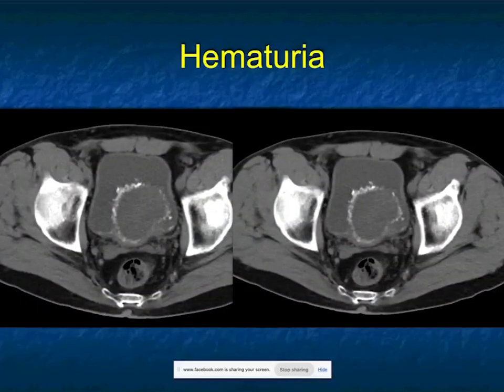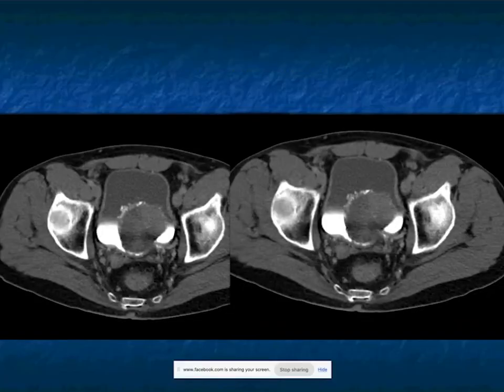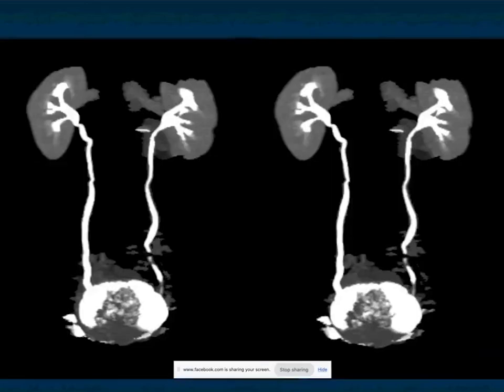Another case, hematuria, non-contrast scan. There's a big mass in the bladder with calcification. There aren't that many masses in the bladder that calcify. Here it is a little bit later with contrast. Leiomyoma, but usually they don't calcify and they're pretty rare. We have reported some larger ones. Duplication cyst, it's not a duplication of the bladder. It's not a diverticulum. Calcification pushes you always toward neoplasm.